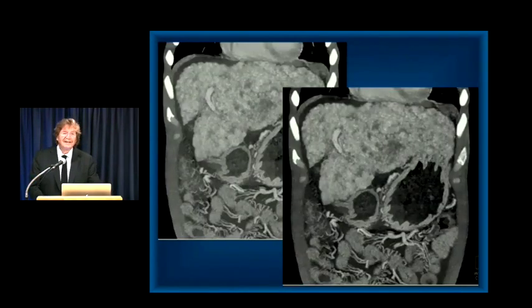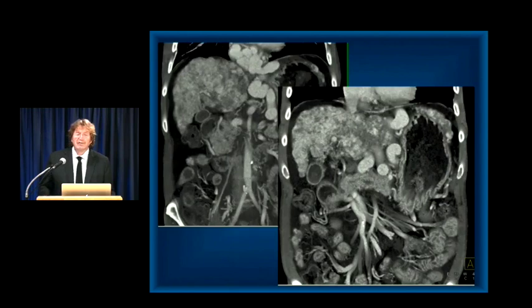Here it is again, that nodularity, and this is very classic for cirrhosis, though I will admit when you have a liver that looks this bad, it's very hard to exclude something, for example, in this case in the left lobe, and say there's no hepatoma present. It can be tricky. At times, MRI can be very helpful in this regard. Again, looking at the sequences from arterial phase through venous phase, usually you can be certain that there isn't hepatoma present, but sometimes it's very hard.